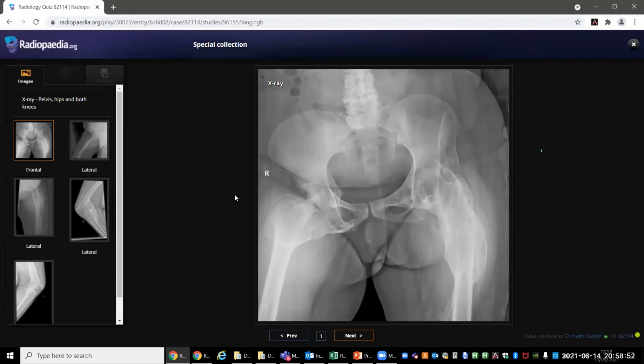Is there a possibility of a trauma in this patient? Maybe he is a neglected case of trauma, because there is a periosteal reaction and irregular osseous formation around both hip joints, specifically the left one, disturbing the femur and the pelvic bony cage. Soft tissue, yes.